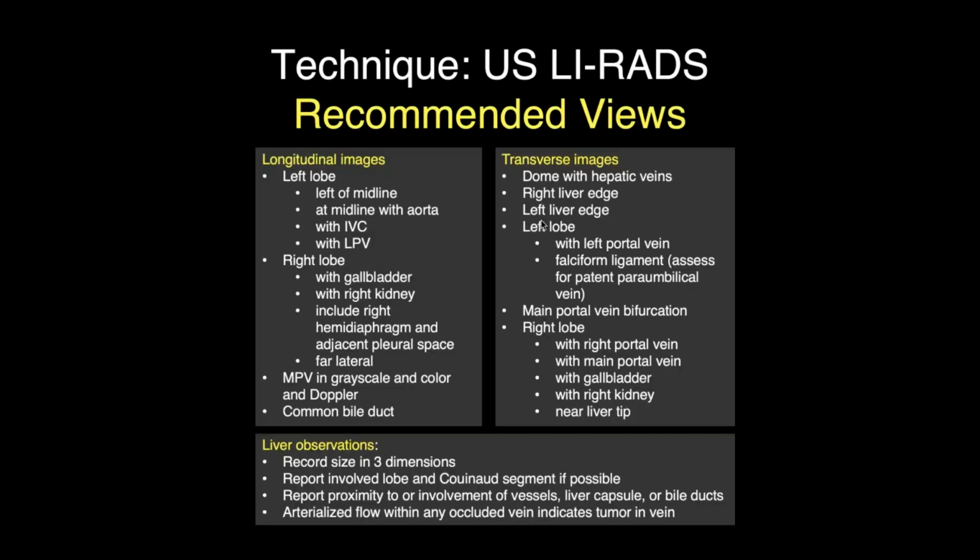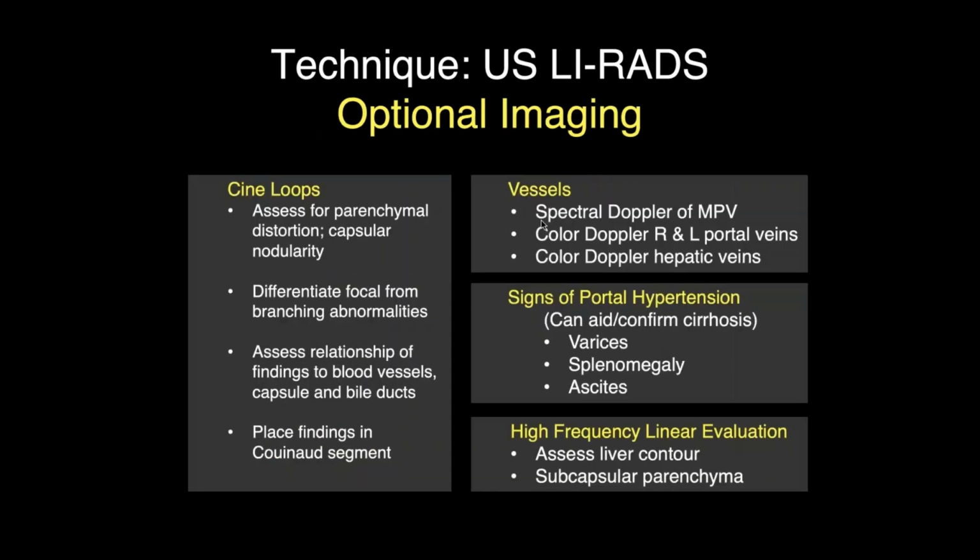In the ultrasound LI-RADS core, we have recommended views to be used for screening and surveillance ultrasounds. We also have views and techniques that are optional. We list them as optional, although we do feel that these optional views can enhance the evaluation in these patients. Okay, so this is the meat of what ultrasound LI-RADS recommends.